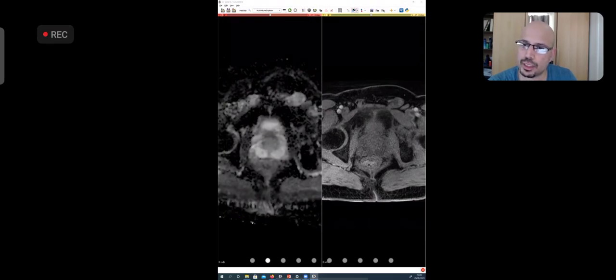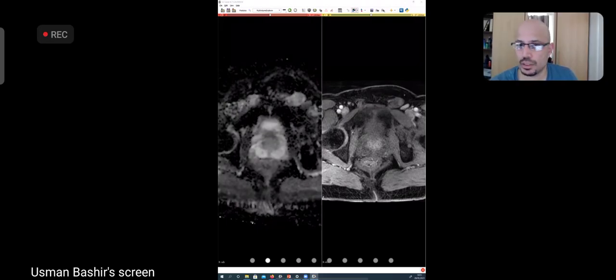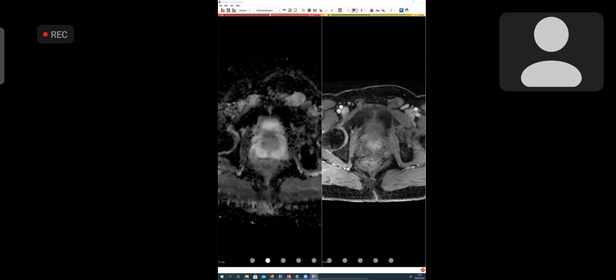अब watch करें contrast वाली window को. You see how contrast is now appearing in the arteries? Now, you see how contrast first appears in the transitional zone. That is how it should happen. Transitional zone enhances. Peripheral zone, you can see, is still dark. Some of the vascular structures outside the prostate are enhancing, right? But not the gland itself. You can see a little bit of faint enhancement maybe is beginning to appear.